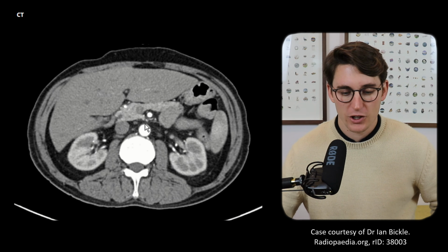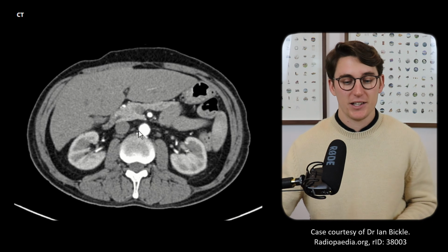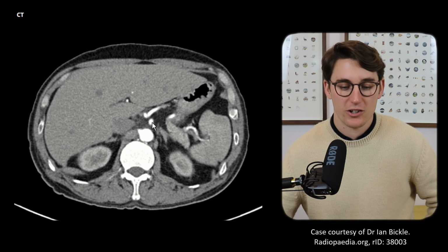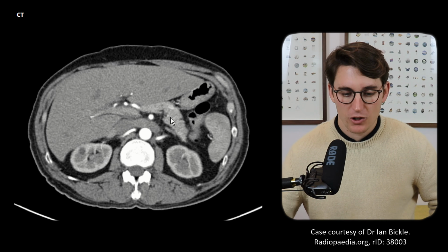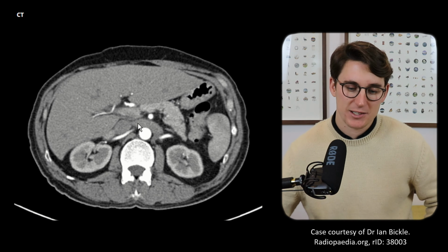And as we scroll down further, we can also see that the duodenum is going to come across here. And if the SMA was to impinge the duodenum, that's what's known as superior mesenteric artery syndrome. So let's follow that SMA off of the aorta. We see that it goes behind the pancreas here, the uncinate process coming around the SMA.